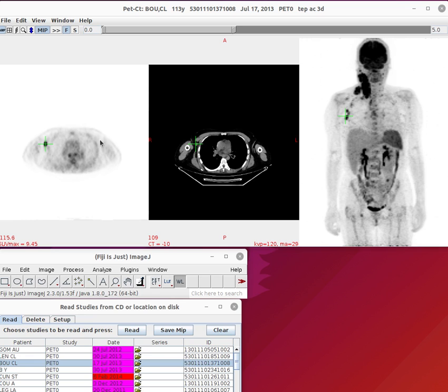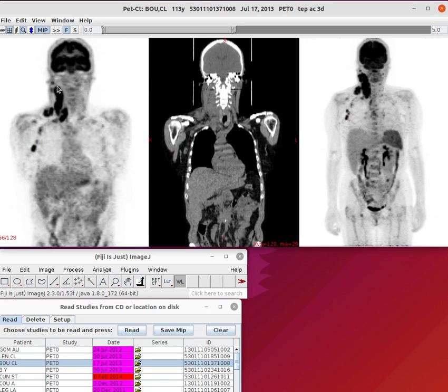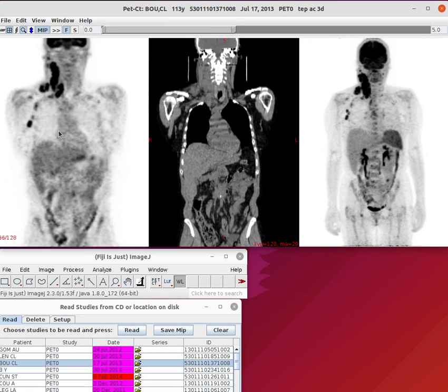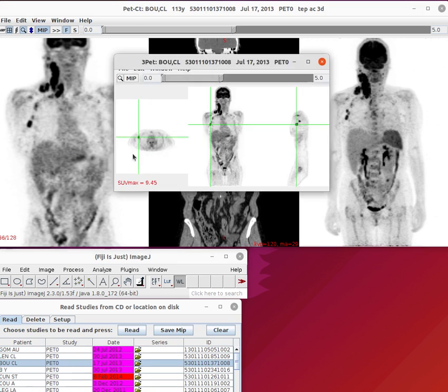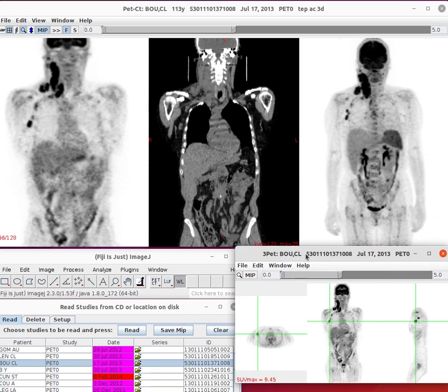So if we're going to use the coronal, let's go first to the coronal. And to make it more interesting, I'll zoom it a bit. Here I can see the top point, and then the bottom point is somewhere here. Okay. Now let's also look at the 3 view, because you can see the measurements here. I'll put the 3 view down here. And now I'm ready to begin.